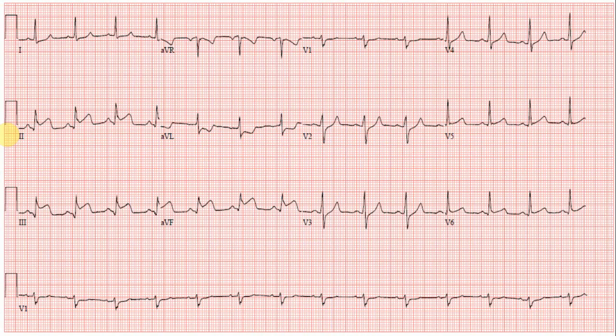So this is a 12-lead ECG, and as you can see, there are 6 limb leads. So this is lead 1, lead 2, lead 3. This is AVR, this is AVL, this is AVF. And then we have got 6 chest leads. This is V1, V2 here, V3, V4, V5, and V6. At the bottom, there is this rhythm strip, which can sometimes be useful, especially if the patient has got an irregular rhythm or some rhythm problem.